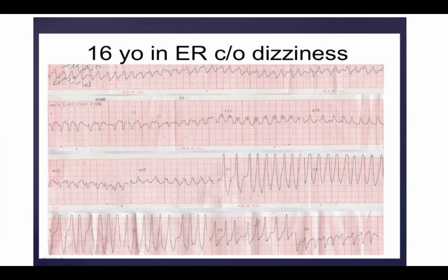Okay. Now, is he going to be conscious for a long time like this? Probably not. Does the fact that he's conscious mean we don't need to move quickly in our assessment and management of this? No. But my point is simply, you can have rhythms like this and patients can still be conscious and talking to you and smiling and joking. So don't let the fact that the patient is still awake deter you from your rapid assessment and management. So I'll stop there and go forward.